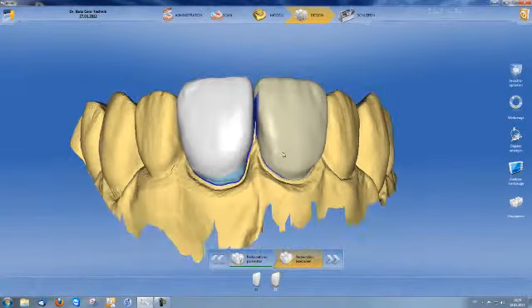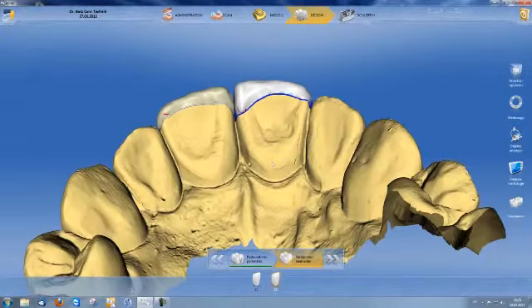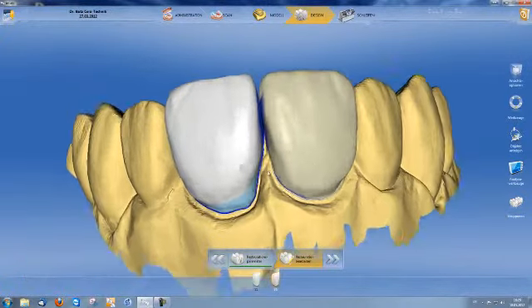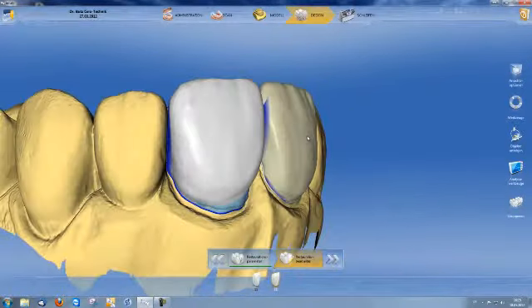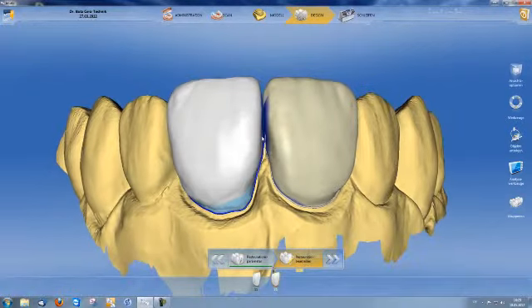In this stage, you can see 2 copied veneers on my preparation and an open midline. I can now change my restoration. Yet, if I change one veneer, then the 2 are no longer symmetrical. I therefore firstly activate the grouping tool. Group, activate tooth 11, both are now highlighted white, and I can now ensure that the design is symmetrical.